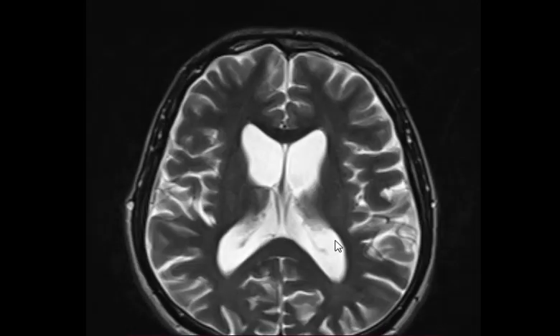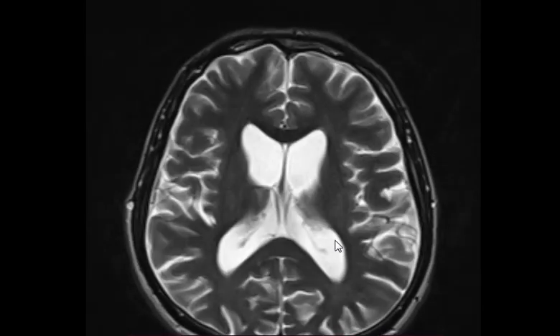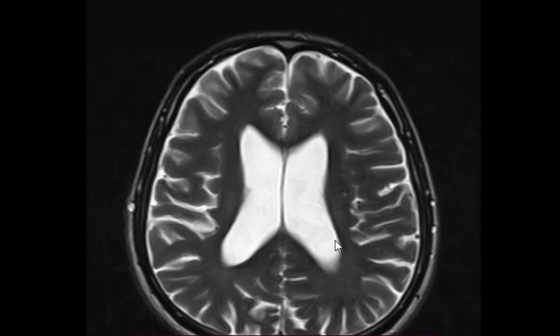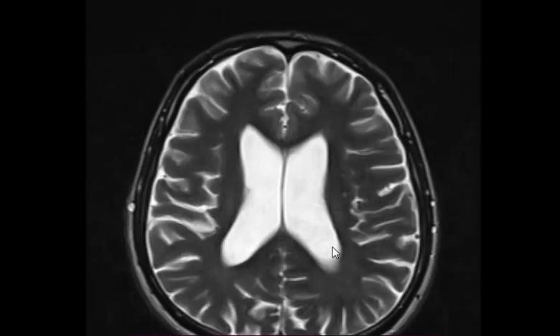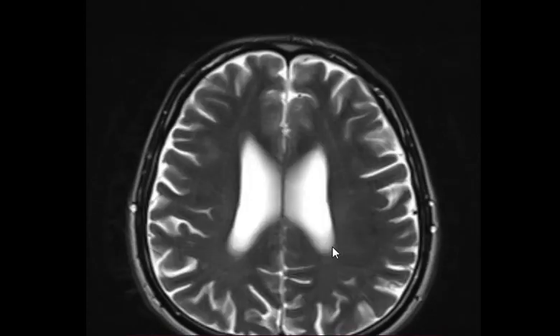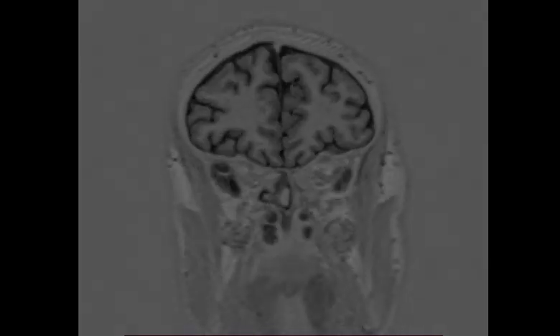Do we have any migrational anomalies? No. Do we have any signs of hydrocephalus? We have dilated ventricles, not hydrocephalus. There is a big difference. Patients with brain atrophy have dilated ventricles, they don't have hydrocephalus. Hydrocephalus is when you have dilated ventricles with effaced cortical sulci. If the cortical sulci are normal or prominent, like in this case, this is not hydrocephalus. This is just part of brain atrophic changes.